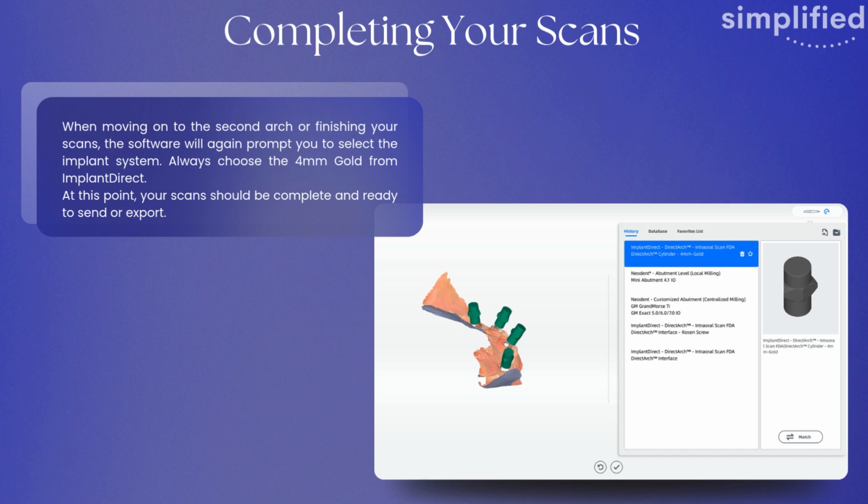When moving on to the second arch, or when finishing your scans, the software will again prompt you to select the implant system. Always choose the 4mm gold from Implant Direct. At this point, your scans should be complete and ready to send or export.